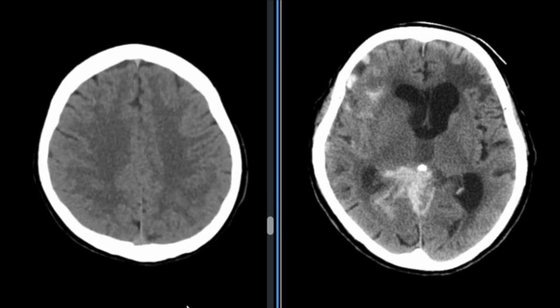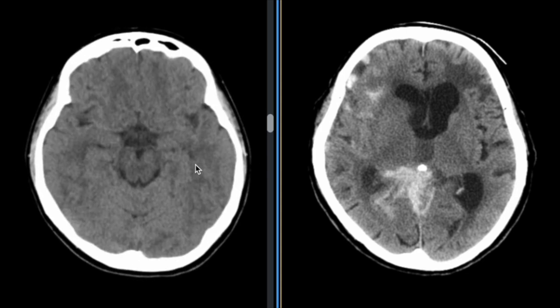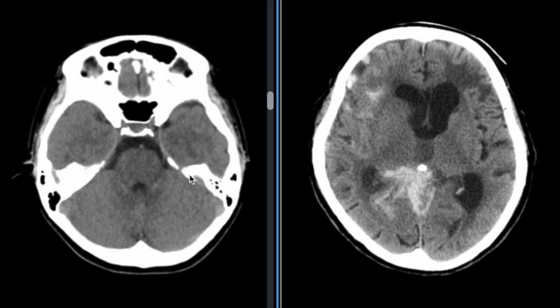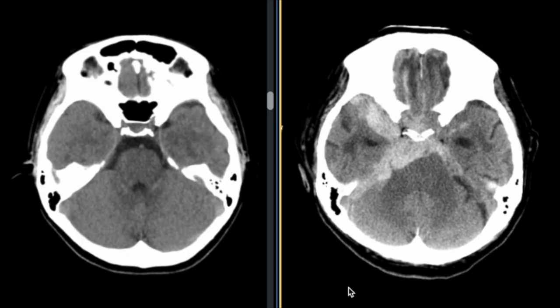In the normal brain on the left, the subarachnoid space is filled with cerebrospinal fluid, which is similar to clear water, so there's no blood and it appears dark. On the right, where subarachnoid hemorrhage is present, the subarachnoid space looks white from the blood. Even though blood should be diluted by cerebrospinal fluid, it still appears white on CT, which indicates a significant volume of bleeding. The poor prognosis of subarachnoid hemorrhage stems from the brain damage caused by this hemorrhage volume and from subsequent complications such as hydrocephalus and vasospasm.